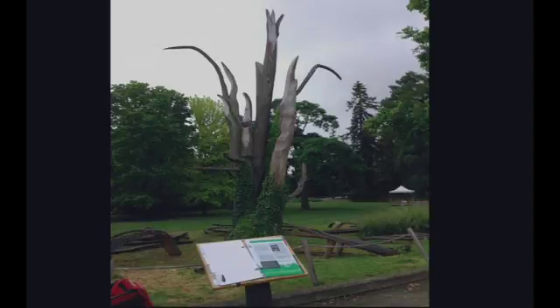So as an artist has carved a work of art from a dead tree in this park in Bordeaux, France, we will slice through 3D volumes to obtain our work of art, which is a final product that answers a clinical question.